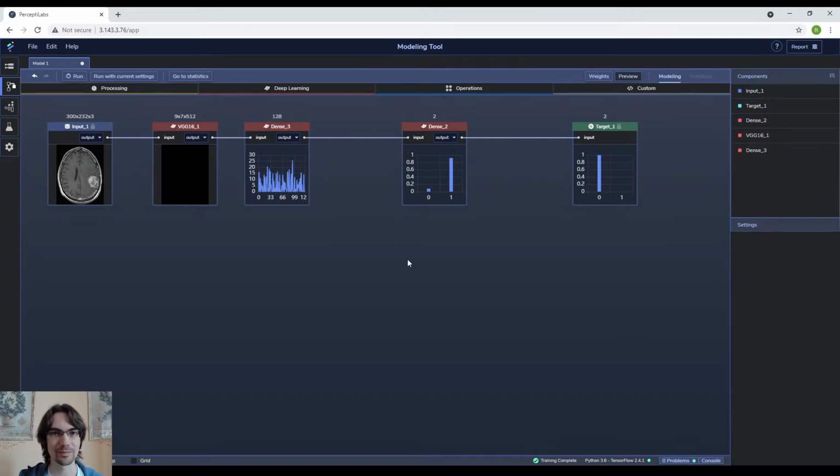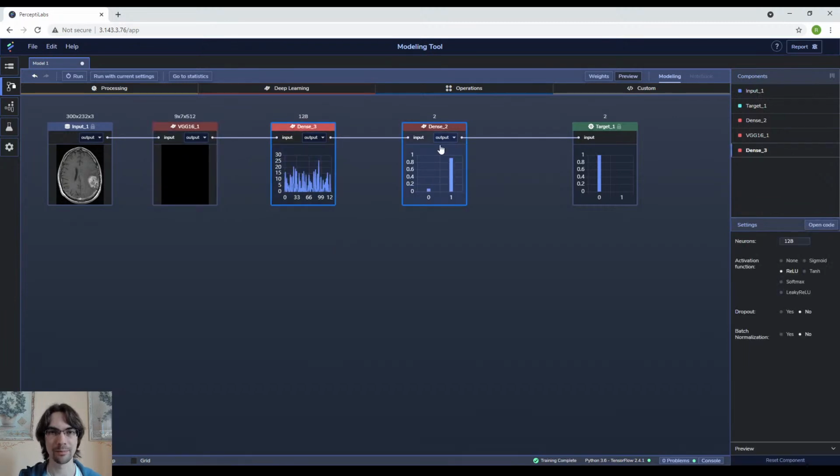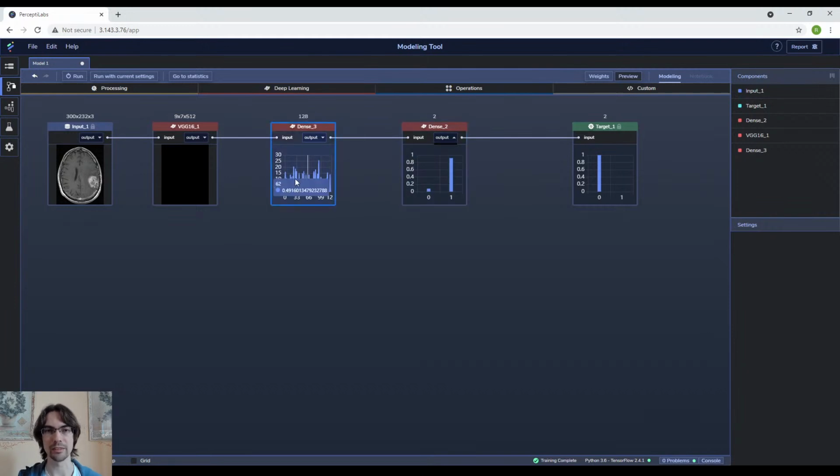And yeah, it seems like this one makes quite a lot of difference in this one, which is not surprising since this one's frozen, this one's very thin. Well, it has more parameters since it's connecting all of these neurons to these ones, but it's not as impactful as this one.